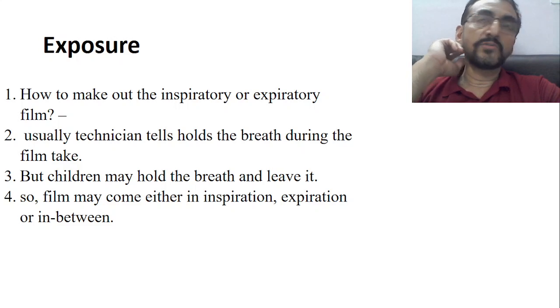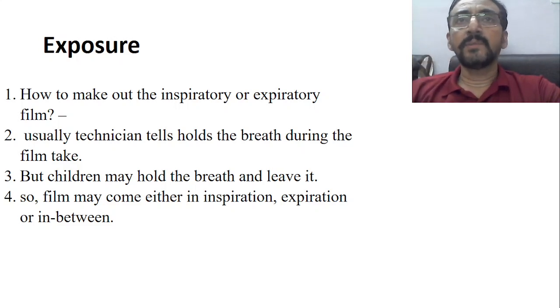Children may not cooperate many of the times, or sometimes technical problems may also be there. Now, if it is the inspiratory film, this is just common sense. Suppose the X-ray has been taken during inspiration, of course the lungs are very well expanded, and usually the technician will tell you to hold the breath during the film take, isn't it? So we know that.